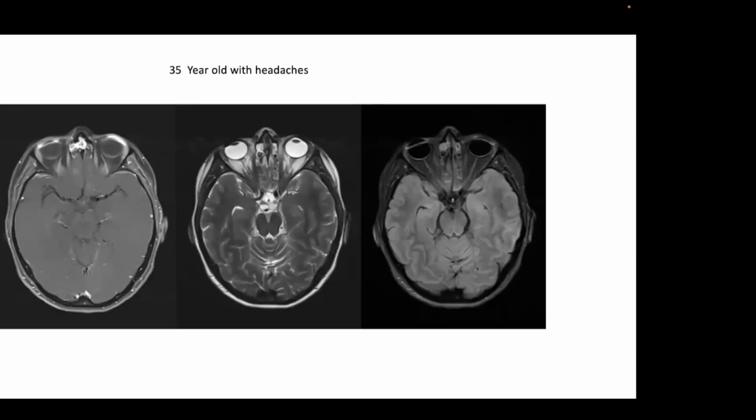All right, who's going to look at this one? Hovhannes, what do you think about this patient who comes in with headaches? And so here we see the T1 weighted scan, the T2 weighted scan, and the FLAIR scan. The eyes look a little funny.